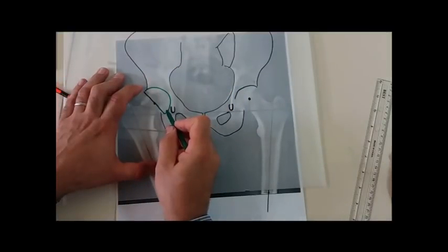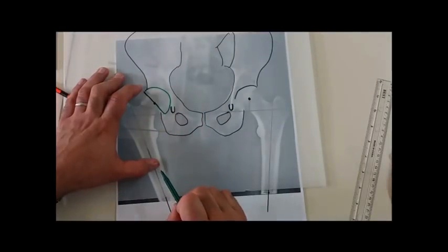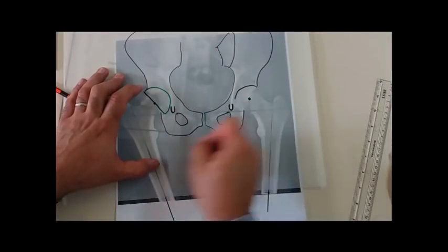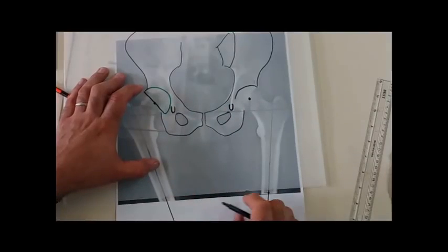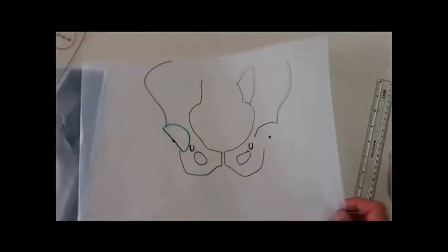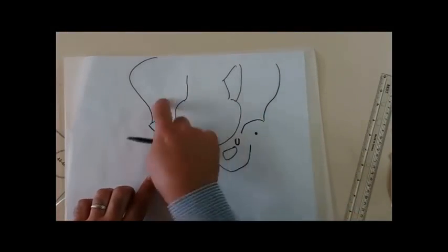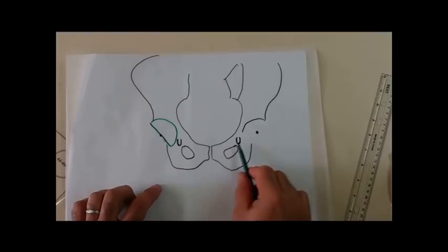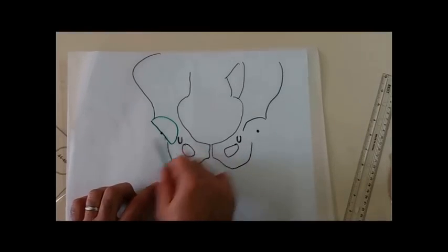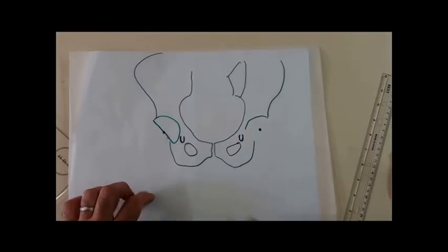This green colored marking is the acetabular component, and the black marking is the whole pelvis, right and left, together with the teardrops and the center of rotation. So I finished templating the pelvis. Now, I have finished with the tracing paper, fixed both hemipelvis, the whole pelvis, together with the teardrops, both centers of rotation as well as the acetabular component templating.